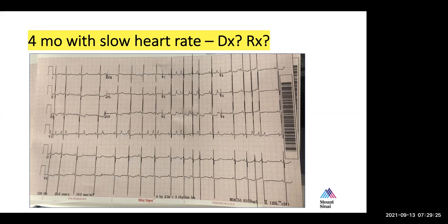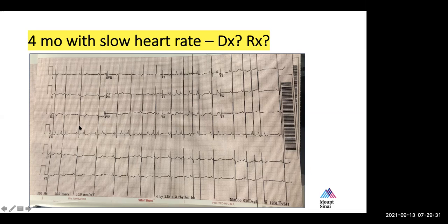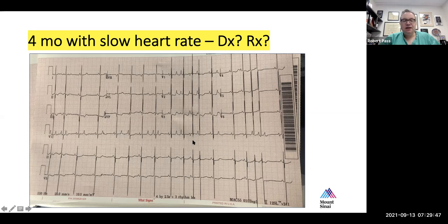Right. The second one is at a rate of 250 or so. Oh, you're right. I was counting from the, yeah. So I don't think it necessarily means the AV node is diseased. Right. These PACs are so premature that it would be unfair to besmirch the AV node of this patient because they can't conduct some of them.